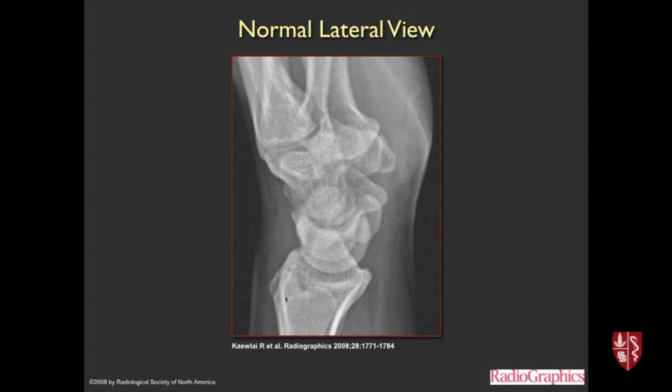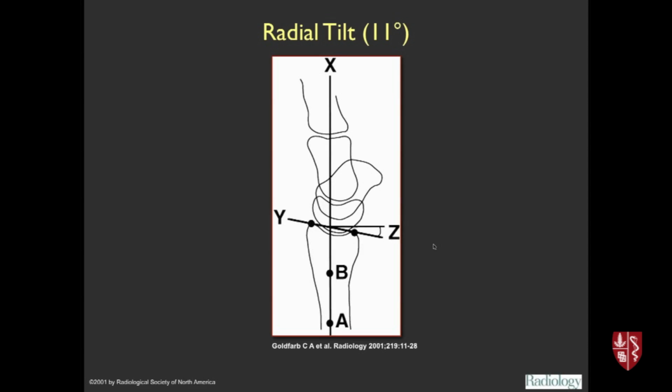So here's a lateral radiograph of the wrist where you have radial styloid through here. Here's the distal ulna. And tilt is the fact that there's a palmar tilt of the distal radial articular surface such that it's about 11 degrees relative to horizontal. So here's the diagrammatic view of that. Here's palmar and here's dorsal. So for the distal radius, this angle is normally about 11 degrees. If somebody loses that tilt from a Colles fracture, that's important because it changes their carpal mechanics. So the surgeons are definitely very interested in whether there's maintenance of tilt and inclination.